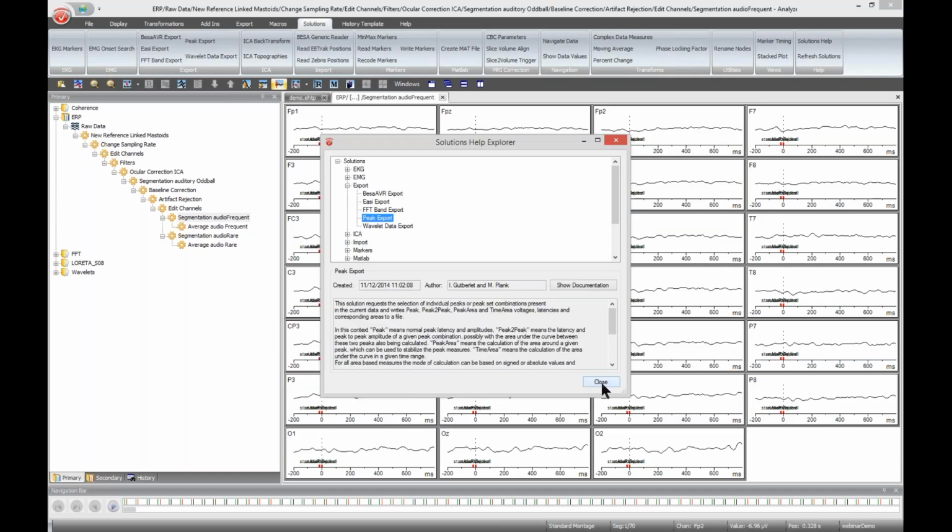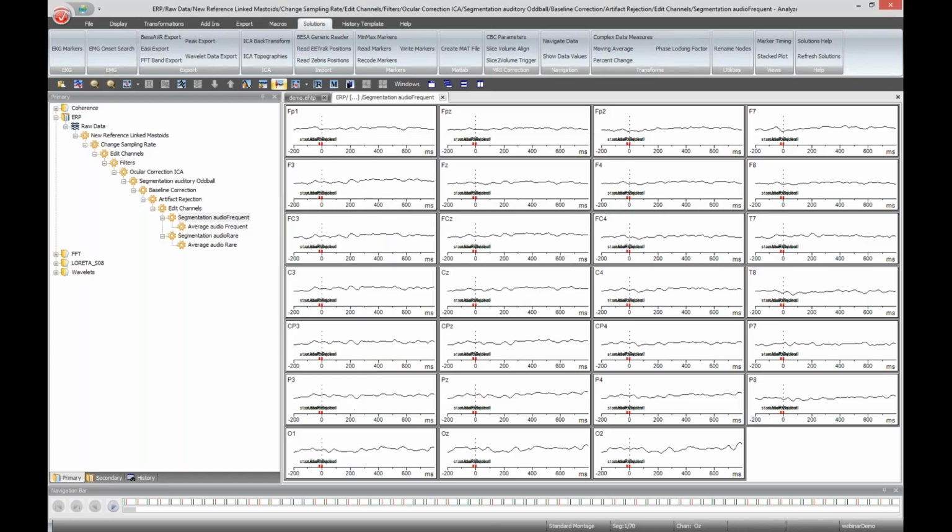Yes, and the important thing of this question was, I guess, to export on the single trial level. This will export for each and every segment of the 70 segments, the output measure you selected from that time range.